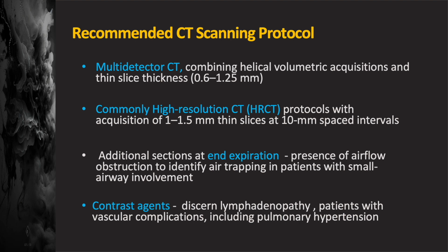A contrast scan may be required when you are suspecting, for example, pulmonary hypertension, or when you want to know more about the lymphadenopathy in early sarcoid stages, or in patients where you want to see the vasculature. Other than that, a non-contrast or only a high-resolution CT scan may be done initially.